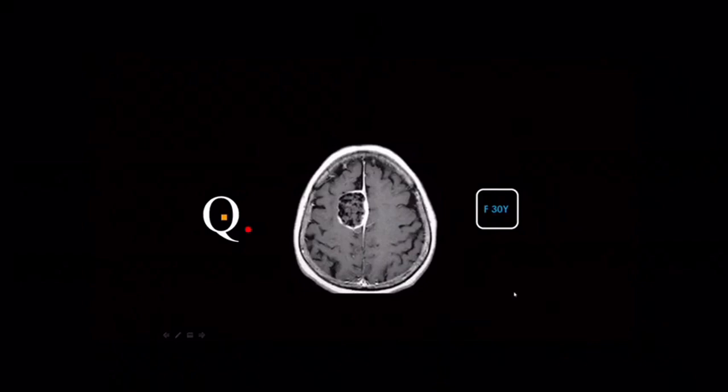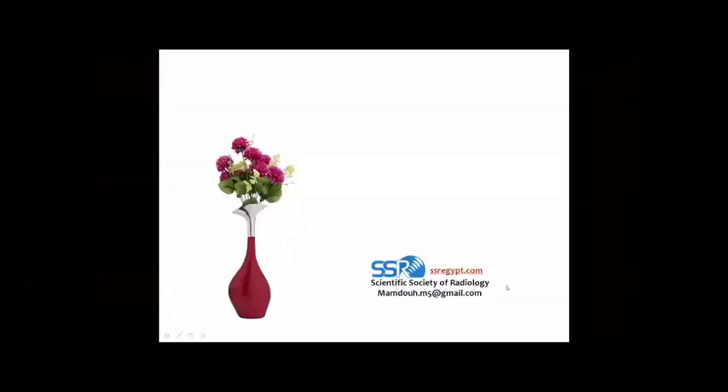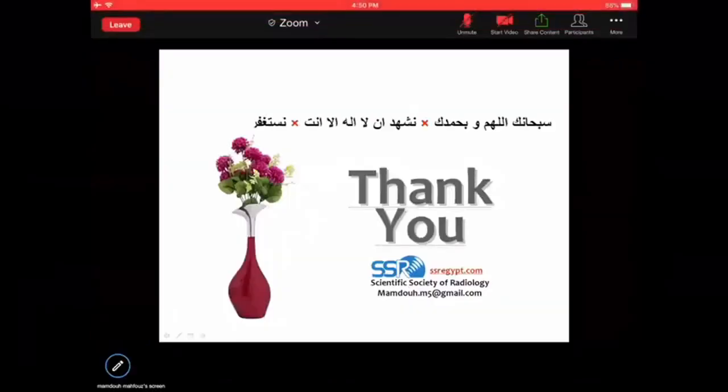Meningioma. Cavernoma? Calcified, okay. Meningioma, yes, very good. This is actually a post contrast T1 weighted image where you get an enhancing component with an evident dural tail, but most of the lesion is not enhancing, and this is because of the calcium. This is a good observation: if the meningioma is totally calcified, you may not get enhancement of the tumor itself, but only enhancement of the related meninges.